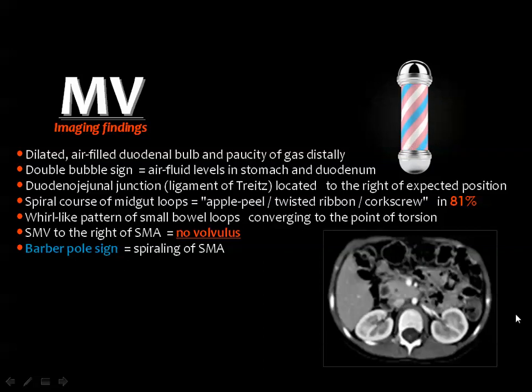In cases of volvulus, the position will be changed, and you get some whorly appearance here, which is characteristic of mesenteric volvulus, and sometimes it is referred to as the Barber Pole sign. This is the Barber Pole sign.